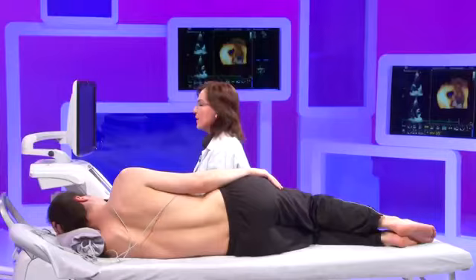If after all this comprehensive examination you still have doubts about the severity, there is also the possibility to compare, by pulsed wave Doppler, the VTI, the velocity time integral, from the pulmonary valve and from the aorta.